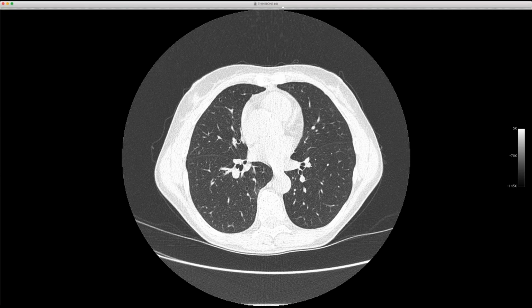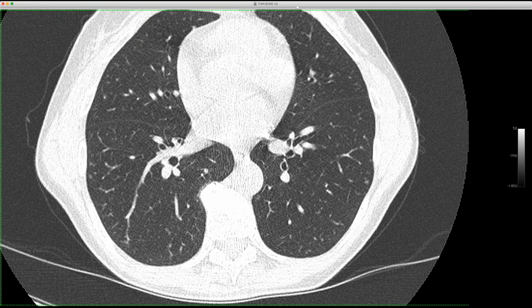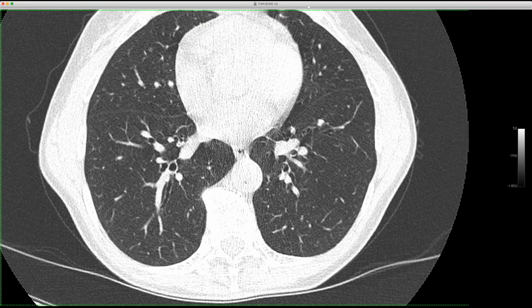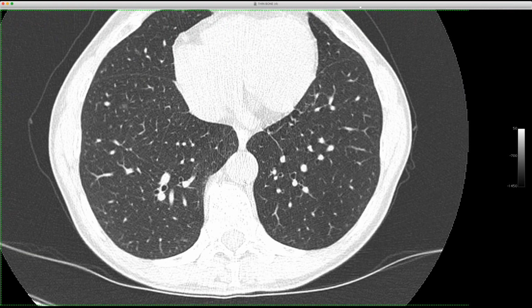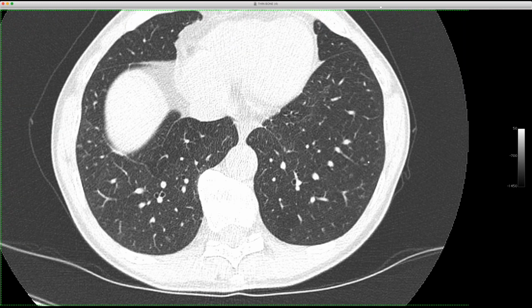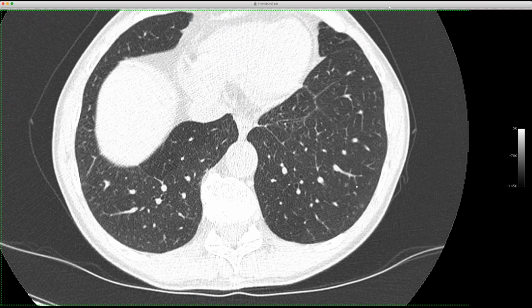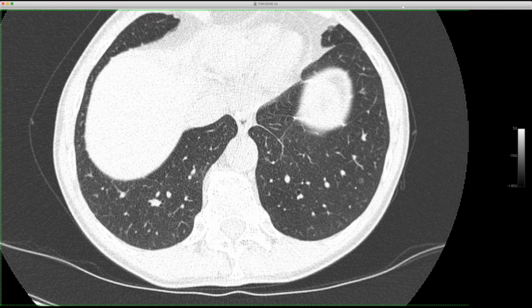Let's see if I can find some that have the little smudgy micro Cheerios, the shriveled up Cheerios. And they go all the way down, and so they caught a few of these on our abdominal CT here. That's probably what they were seeing. You can see them. They're just very faint in the center. There were a couple of them that looked a little bit nicer. Here's a nice little one here.